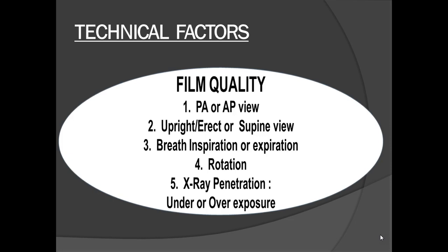Then it's very important again to see whether the film is taken in an erect view or in a lying position. Then comes the inspiration, that is again a film quality factor. The rotation and penetration we will discuss later.